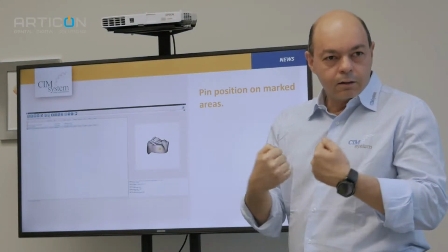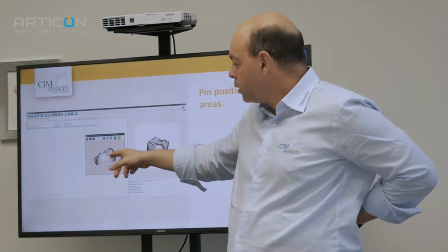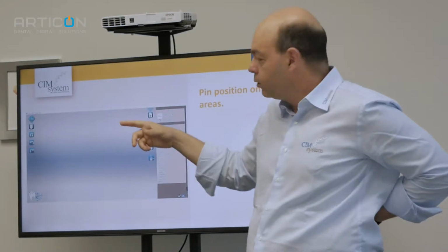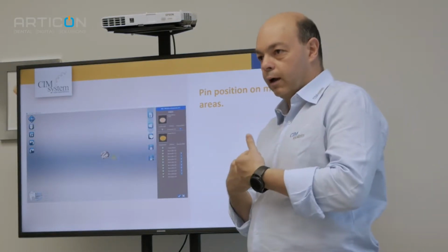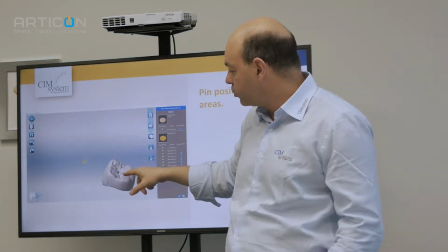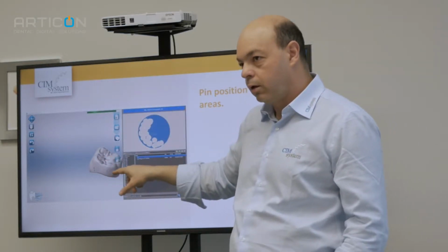to avoid the interproximal area. If you don't need to put the pin in the interproximal area, you open the software and click 2 points or more. When I import this STL in Millbox, it automatically doesn't put the pin in the interproximal area. For example, here I clicked before in Lab 3D Explorer, here and here. Now, when I import the blank, it puts the automatic pin, but not inside this area.